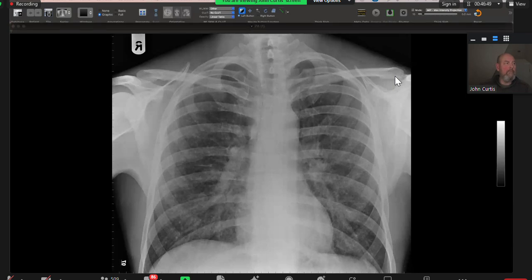So I'm thinking about varicella pneumonia. No, the patient's not well, febrile, and the nodules are no bigger than 3 millimeters. They can be due to metastatic deposit. Possibly. Yeah. But he's got a fever.